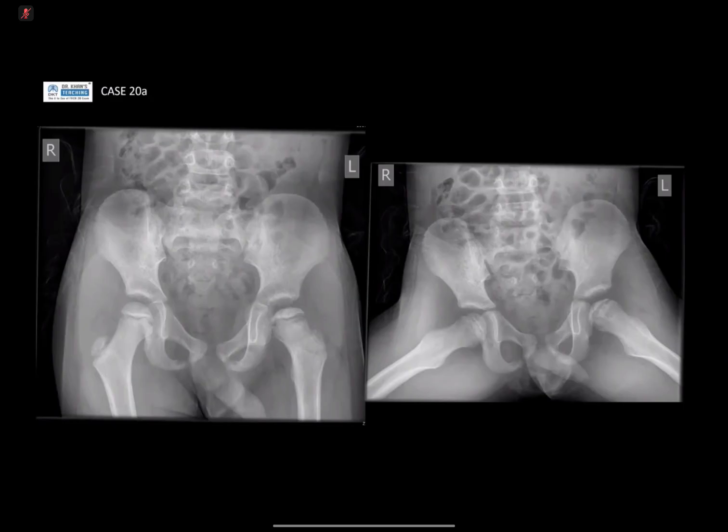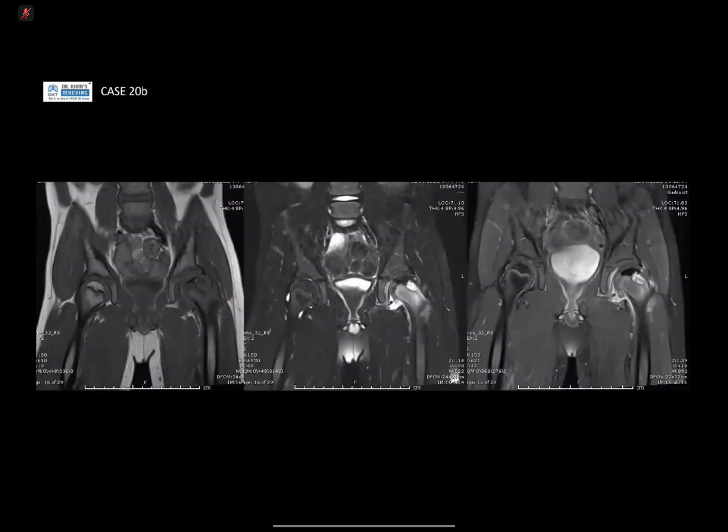The growth plates appear good, so findings are most likely suggestive of Perthes disease, AVN of the left femoral head epiphysis, due to decreased and collapse of the left femoral head epiphysis and widening of the joint space, which is joint effusion, the early sign.